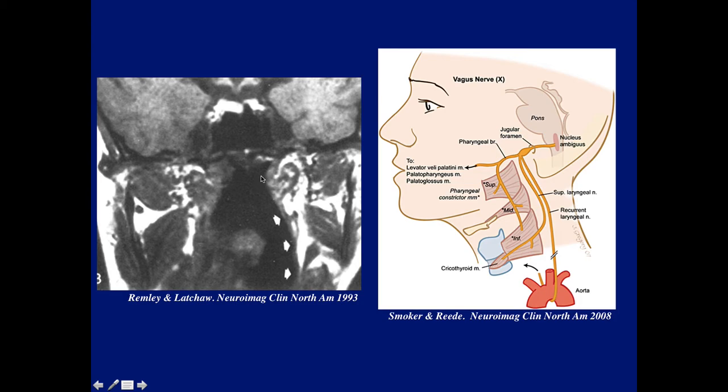And here is another case showing these are chronic changes where the superior constrictor is markedly thinned. The diagnosis was not given here for why that happened, but most likely was again something in the jugular foramen or upper nasopharyngeal space.